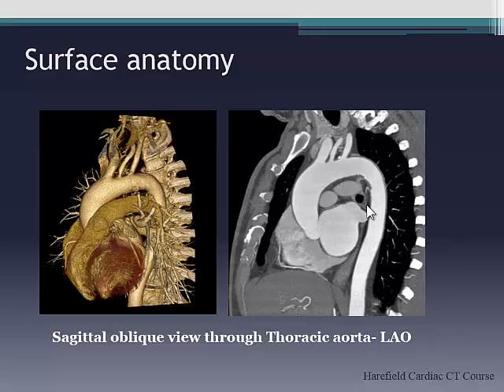So often our surgeons, before they do any aortic valve surgery, even if we've done all the measurements and everything on MRI, still want the CT, because they can sit there, rotate it around, and get the anatomy straight in their heads. They can look at the relationships if they've had previous bypass surgery or a LIMA graft, and the sternotomy in relation to the right heart. So all of these are bread and butter indications for CT, and if you're doing cardiac CT, you'll often be asked to do all of this stuff. So it's useful to familiarize yourself with the anatomy.